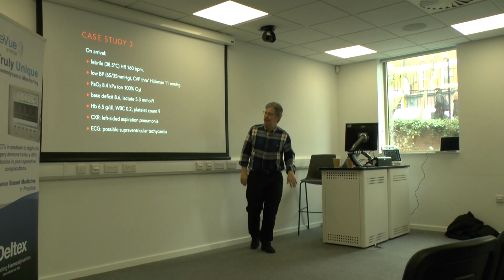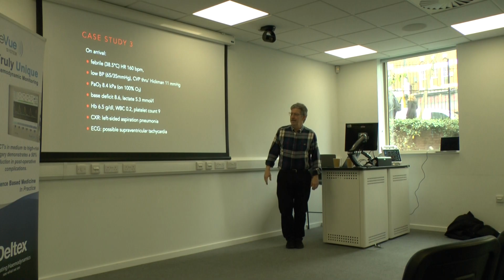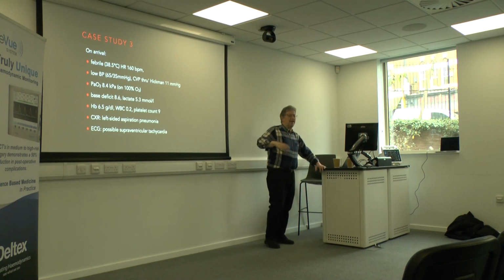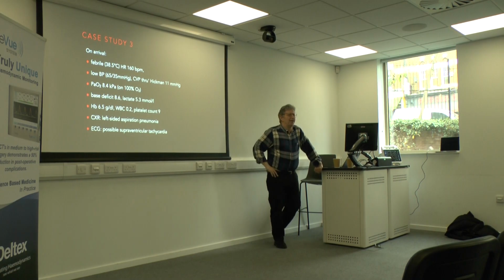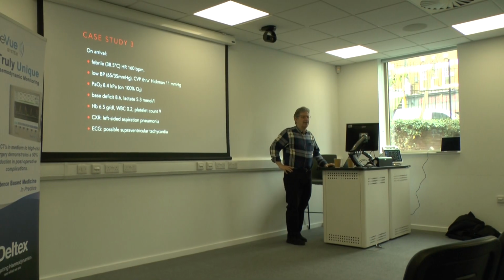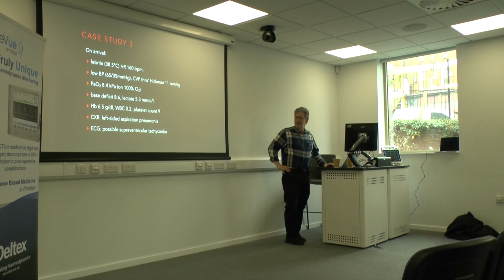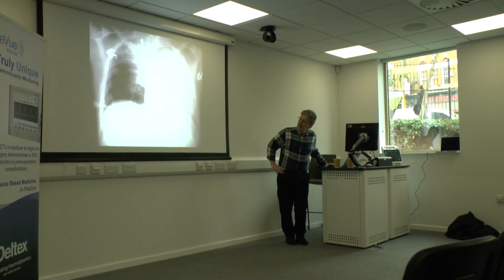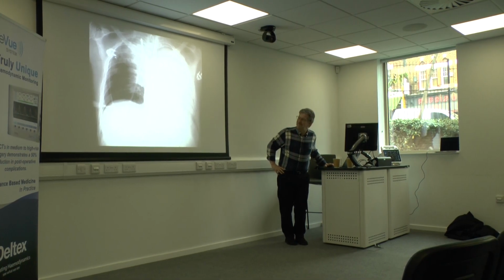He had a whiteout on his left side, I'll show you an X-ray in a second. These things were difficult to read. It was going very fast, and there was a lot of umming and ahhing. Was this an SVT? And the cardiology reg was around at the time, and again there was lots of muttering. That was his X-ray. Not very nice, is it?